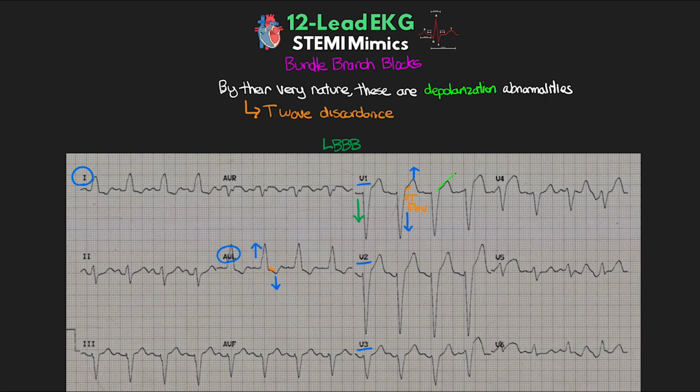Again, we see the same concave shape to our ST elevation here, and then given that we see ST elevation in our anterior septal leads, we wouldn't expect to see reciprocal changes in high lateral, and thus this appears to be normal changes seen with bundle branch blocks. And this morphology and presentation is also going to be the same that we expect to see with our ventricularly paced rhythm, with the exception being that we would also see pacer spikes preceding the QRS complex.